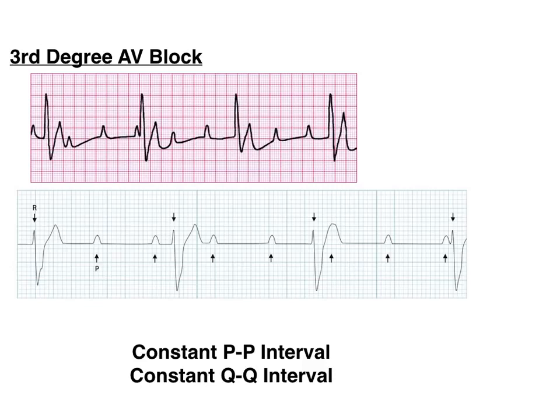In a second-degree AV block, there are two types. The first type is a Mobitz Type 1, also known more commonly as a Wenckebach block. In a Wenckebach block, the PR intervals get progressively longer before dropping a beat. On EKG, the PR interval will be greater than 200 milliseconds and get longer for a few beats before a QRS complex completely disappears. The mnemonic to remember this is that Wenckebach gives you warning, or longer, longer, drop, that is a Wenckebach block.